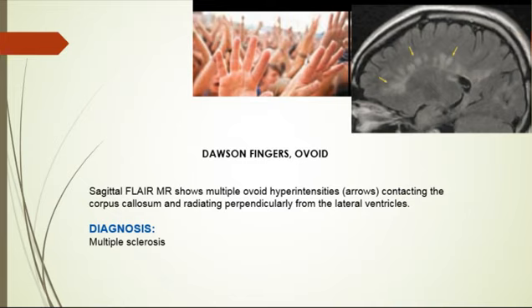Also, there is a differential diagnosis of other demyelinating diseases, such as acute hemorrhagic leukoencephalitis, what's called Weston-Hurst syndrome, in which linear areas of periventricular hemorrhage may be identified on susceptibility-weighted imaging. You need susceptibility-weighted imaging to look for hemorrhages. It's much rarer than MS, of course. Other possibilities include vasculitis, which can be associated with perivenular enhancement and multifocal infarcts.